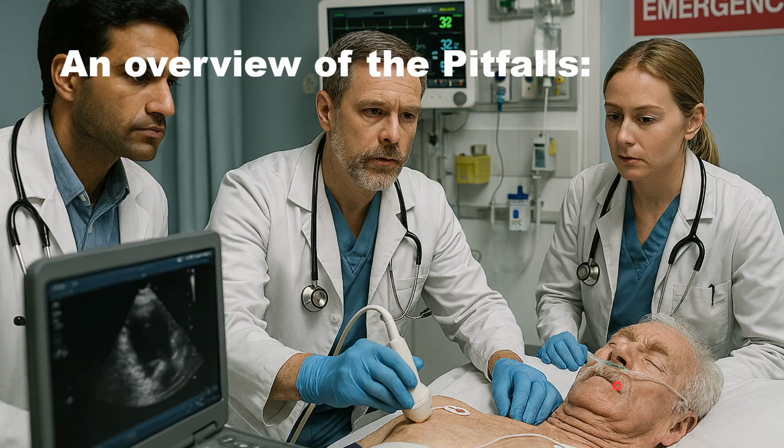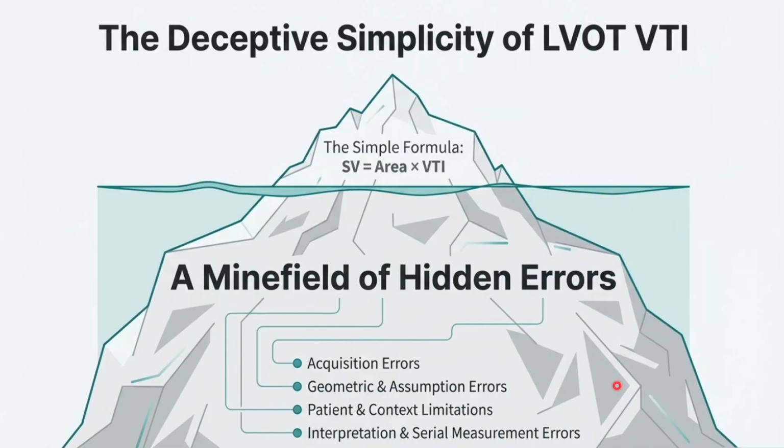Now, the main topic of today is the pitfalls, limitations, the errors of LVOT VTI. As you can see, this is like a minefield, an iceberg. When we talk about the LVOT VTI, we are talking about the simple formula that the stroke volume is equal to the area multiplied by the VTI. However, we are looking at the tip of the iceberg. There is a minefield of hidden errors. For example, there can be acquisition errors, there may be geometric and assumption errors, there may be patient and context limitations, and of course there may be interpretation and serial measurement errors. Over the next few minutes, we will discuss each of them, and also we are going to tell you how we can address these issues, how we can make it better, how we can make the best use of this useful technique.